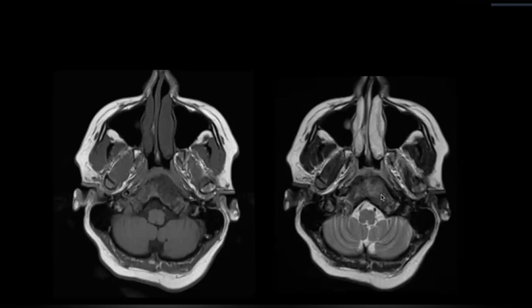So once you have a dark lesion on the T2, I will show you many other cases. To me, the darkness on T2 is very important because most of the lesions are bright. Brightness on T1 is very important because most of the lesions are T1 hypointense. So whenever I see this kind of a difference, those are usually very helpful. And the other point is, if you have a bony lesion, ask for a CT. You know what are the causes of dark lesions on T2?